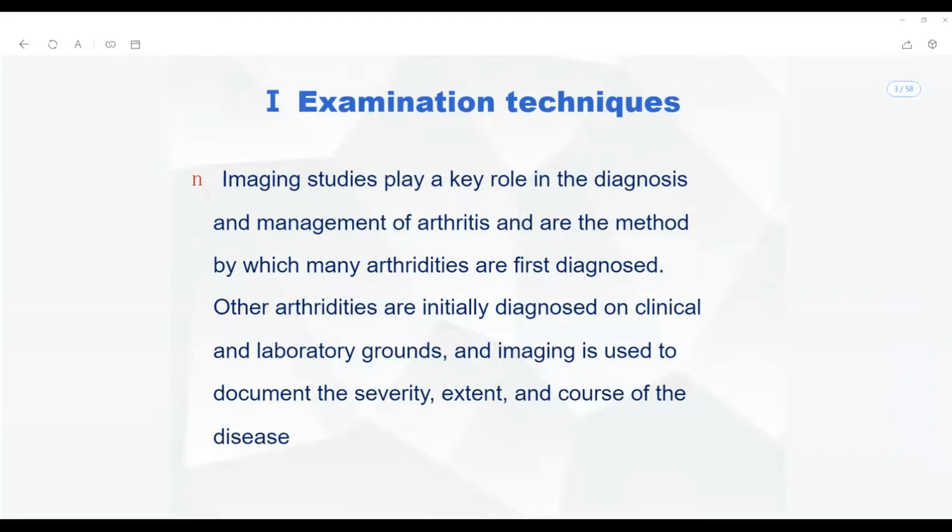Is there any fracture that causes swelling and restricted movements, so we have to do X-ray? Well, see here, you are thinking all about bigger diseases, which may not be technically true. Any idea, Reshma? What are you looking for? You are the one who said, I'm going to look for the X-ray and I'm going to confirm something. Okay, what are you going to confirm here? See, we are not going to confirm anything. The only thing you see here, I am expecting it to be normal.